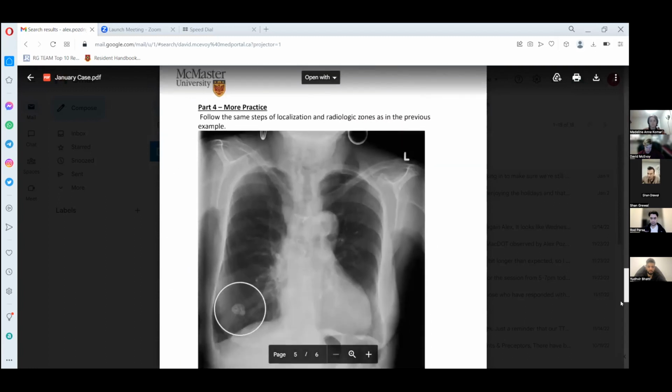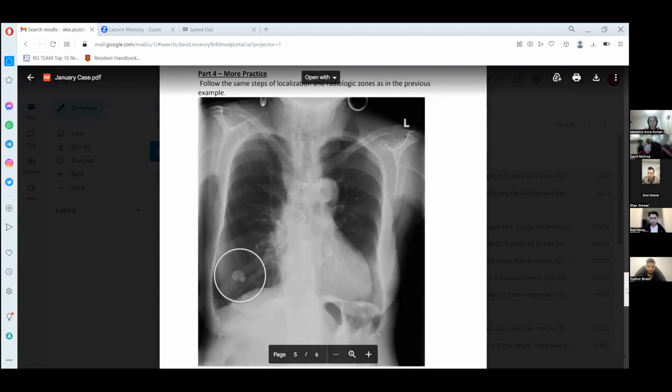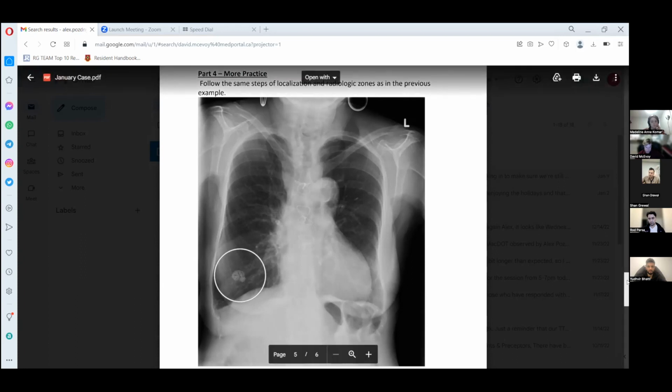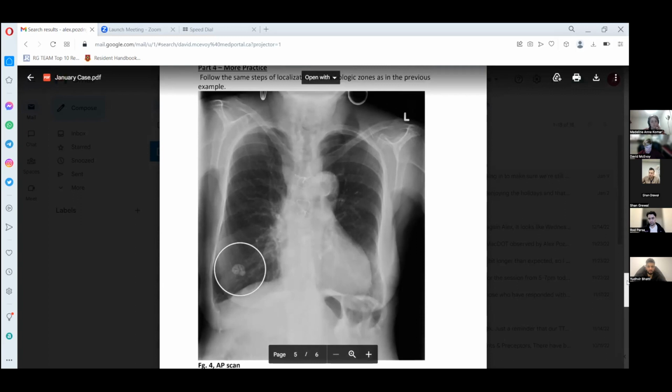So probably what happened is maybe the patient wasn't really mobile, they were in the stretcher, and they probably did a portable radiograph, or for whatever reason, they had to be lying on their back, not on their chest. So that's why this will actually exaggerate the heart, because the heart is located further away, and there is more dissipation of X-rays, which on the eventual film is going to create more of the magnification bias. So AP radiographs are actually known to artificially enlarge the size of the heart, so we can't really conclusively tell if there is cardiomegaly.